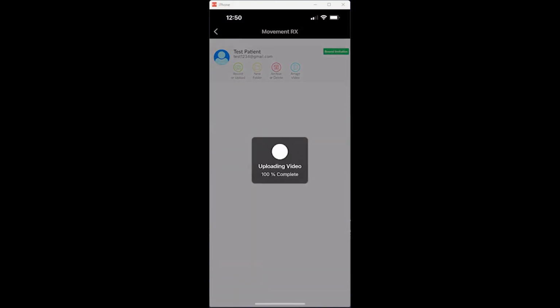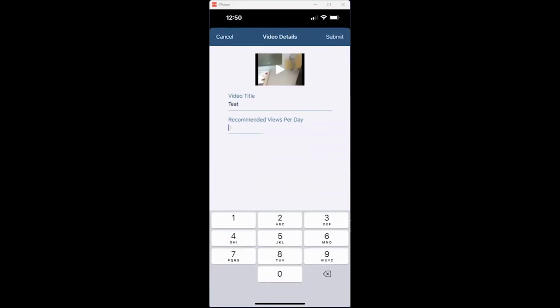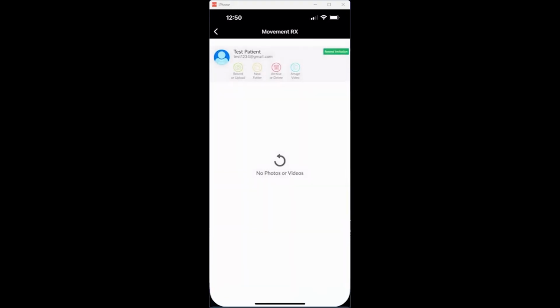We upload the video, we name the video, and we're going to say, okay, now I want you to do this 3 times a day, once a day, twice a day. We're going to hit submit. Okay, so now this video is going to live in their chart. There we are. So it populates.